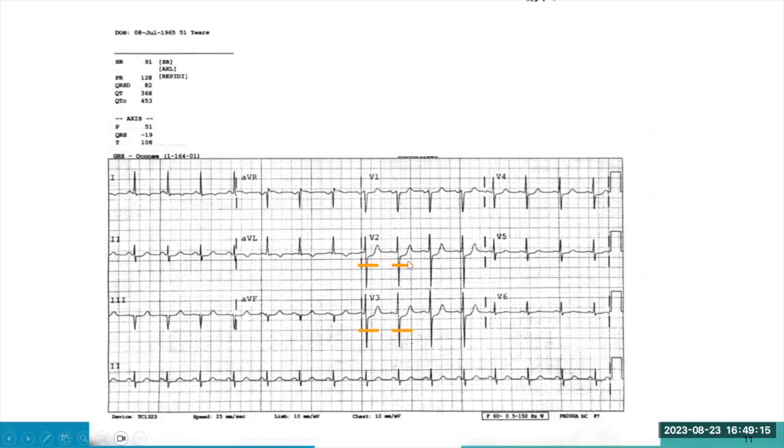It's the same one, but basically the things above the yellow line just show a little bit of that ST depression in leads V2 and V3. So it doesn't look horribly concerning, but there is something very specific that we do need to be concerned about with this EKG.